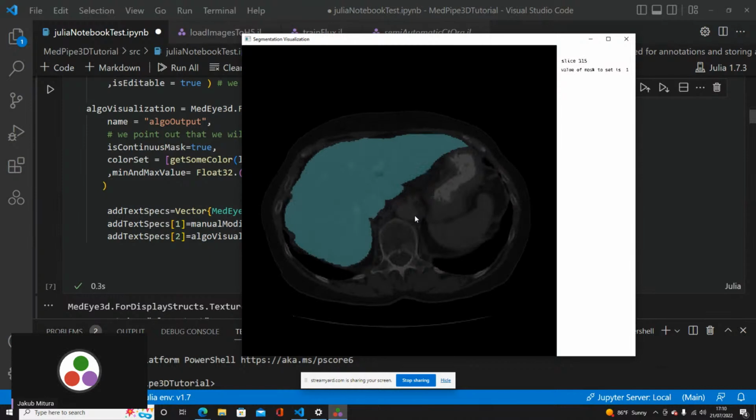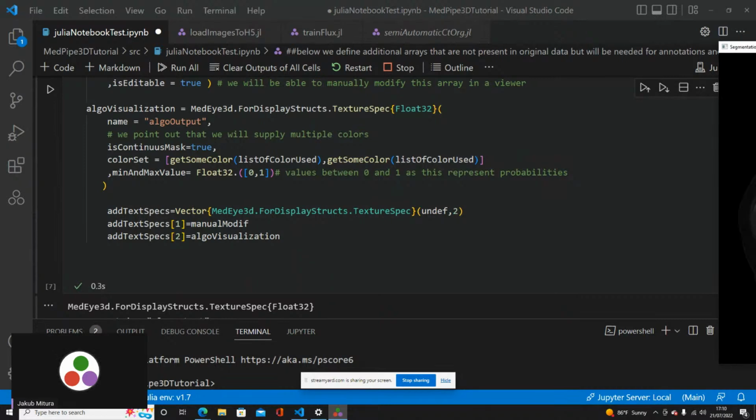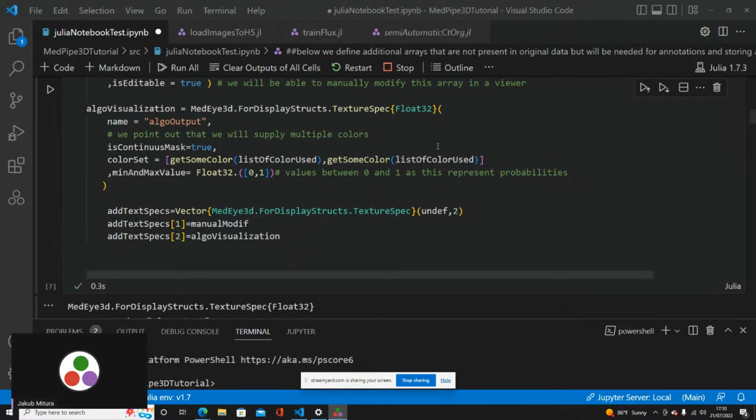These are the most important. There are also others, but let's not delve into too much detail for now. If we have some time, I will give you more detail about how to use them. If the visualization does not work for you, soon we'll get to a more algorithmic approach that you would not need visualization for, and I will help you later to remedy this problem. Still, if you have any problems, please write them in the chat.